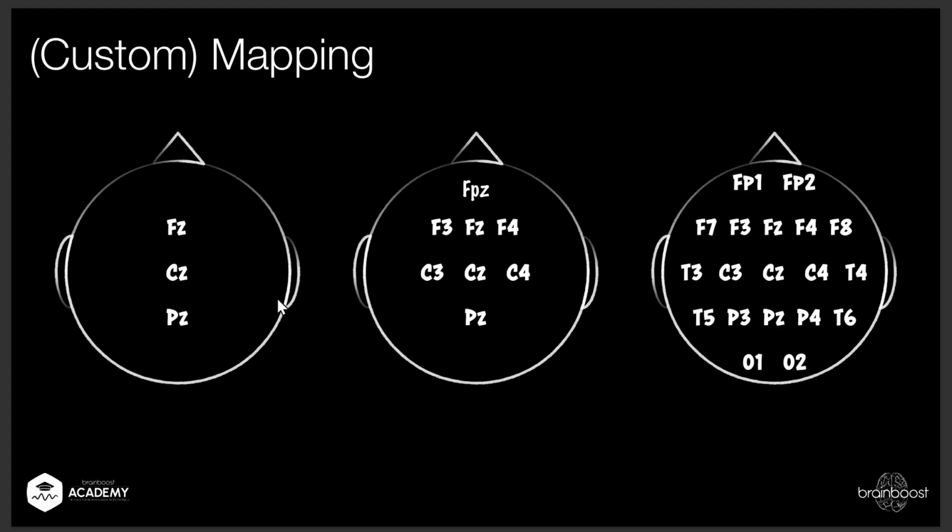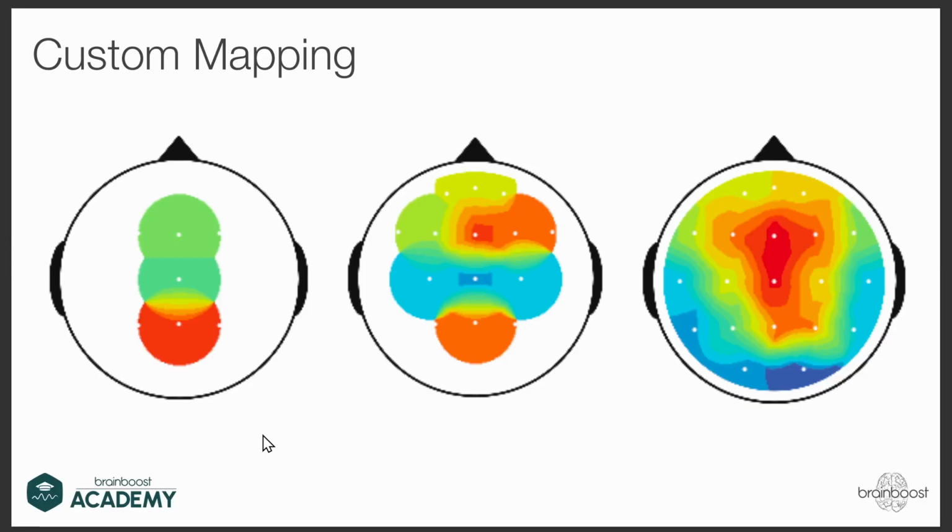And yes, here, if you only have, for example, those 3 positions, it is not a very intense view for a brain map. So if you create a brain map with 3 channels, it still is a brain map. But of course, when you sell people a brain map, or you talk about, hey, let's do a brain map today, they wouldn't expect this one. They would expect something around this one.